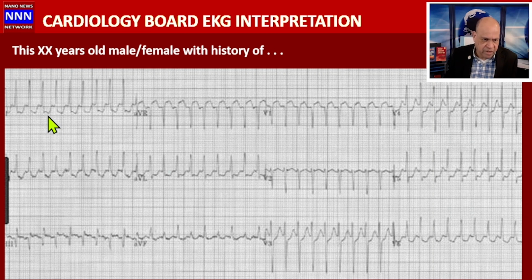The ST segment depression may be related to just a reduced diastolic filling period and reduced coronary perfusion, and this may be just rate related. But nonetheless, the horizontal ST depression is suggestive of subendocardial ischemia. And along with that, we also have what looks to me like atrial flutter with almost one-to-one conduction.